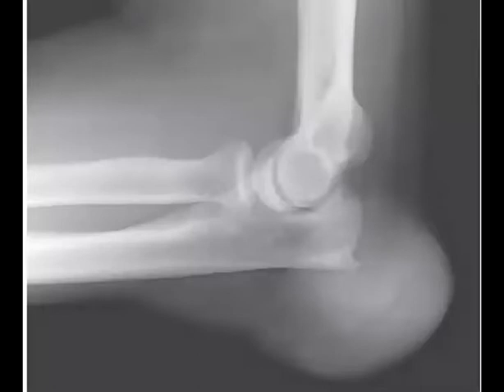T2, yes, perfect, Nermeen, Dr. Fauzi. So T2 because you will find it like dark or low signal intensity. Dark signal. Yeah, also the adjacent bony changes. They mentioned that sometimes the tophaceous deposit may erode the bone and mimic some sclerotic changes.